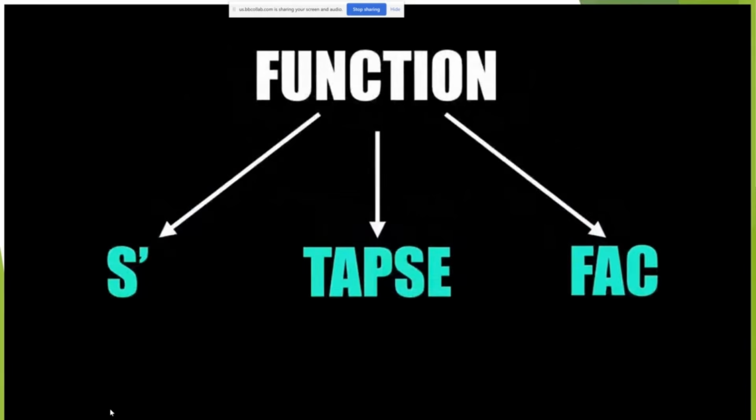Now, there are a couple of different ways that you assess RV function. Remember, we've talked about LV function. Now we're going to cover RV shape, function. But the way that it contracts is really easy. It's basically just all one direction of contraction. The LV has like 3 different ways that it contracts, but the RV is pretty simple. So you can actually do easy calculations. This is the equivalent of doing an ejection fraction for the left heart.